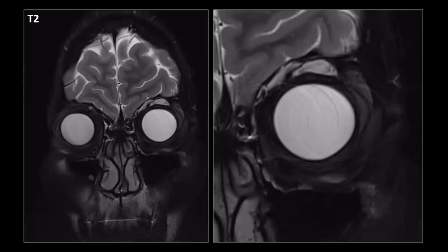Let's magnify this a bit. On this fat-suppressed T2-weighted image, we see these structures that are T2 hyperintense in the extraconal compartment above the eyeball. Yes, these are located extraconally. Why am I discussing them in a presentation on intraconal lesions? Because they can also occur intraconally, and it made sense to discuss this here when talking about vascular abnormalities of the eye. So that's why I'm discussing it over here.